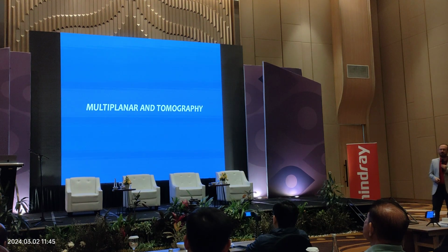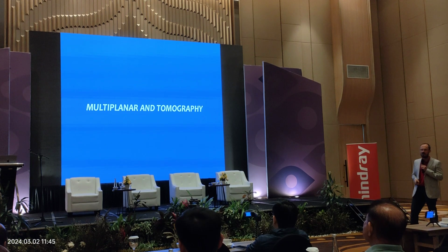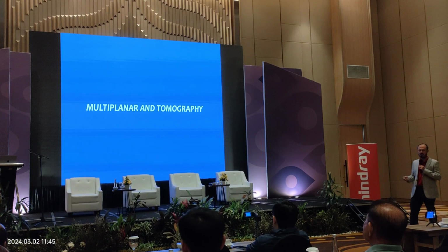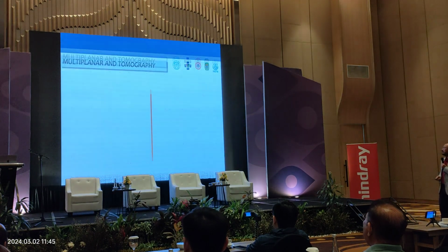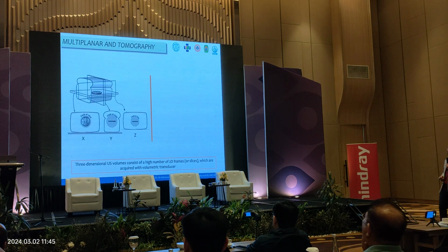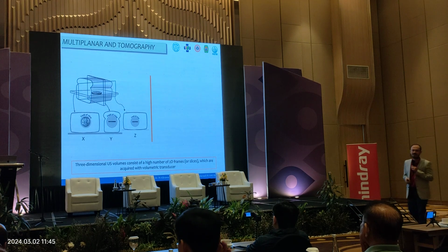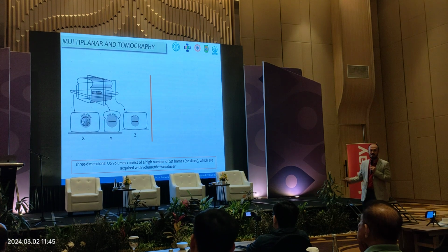So we will start with the most important one, the function of viewing three-dimensional ultrasonography: multiplanar and tomography. If we cut bread in slices, the coronal, axial, and sagittal, that is what we do in multiplanar.